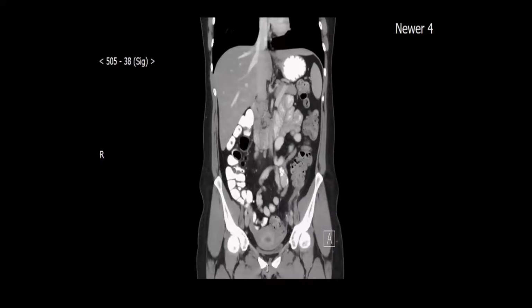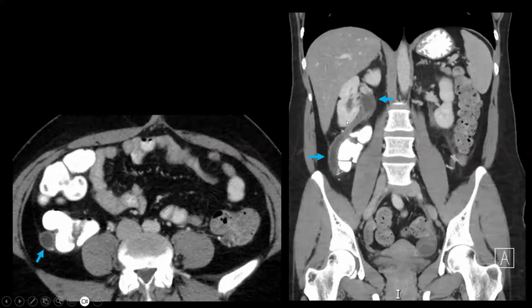And cool. I've never seen that. That's awesome. Why is it like, is there just superimposed infection? Like what's causing all the thickening? That is, yeah, superimposed infection, and the ureters have lost their vermiculation or peristalsis. So a lot of stasis giving rise to that.